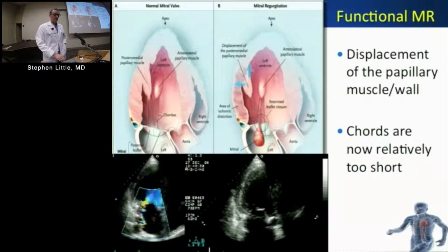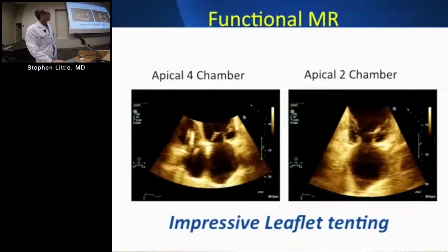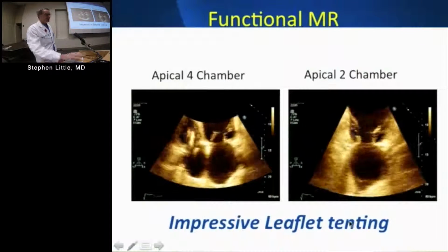So forget the notion that the direction of the jet tells you its etiology. So the chords are relatively too short. This is another slide that shows that concept of tethering. So this is a case where there's clearly functional MR.